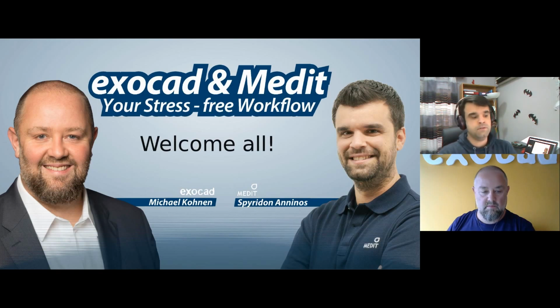So today, what we're going to talk about. First of all, I will show you in the presentation that I have prepared the workflow. Basically, I will describe the whole workflow, how we start, how we scan, and how we send the files from a clinic account to the lab account, and then you can proceed to the design.